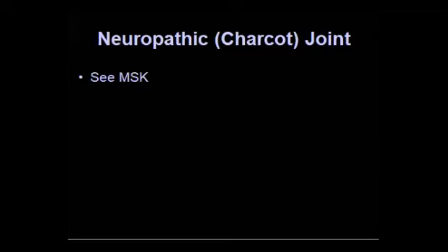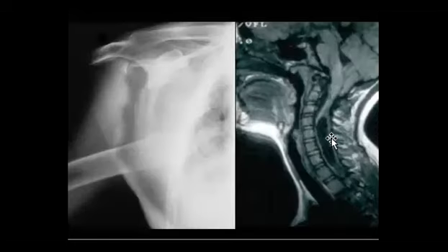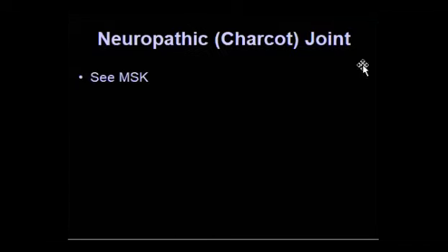We mentioned this Charcot one. Yeah, Charcot joint can be in the pediatric age group. Then search for syrinx, central syrinx. When you find the shoulder much deformed in a young patient with this Charcot appearance, then search for neuropathic Charcot joint.